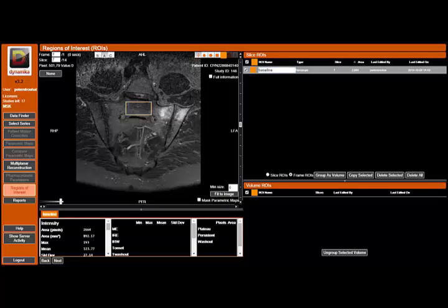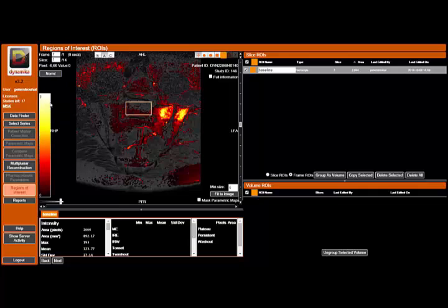So you select a suitable, simple region of interest, map it out over the image, and from that you can then derive a color map image against which to both visually judge and semi-quantitatively assess uptake and signal intensity elsewhere in the image.